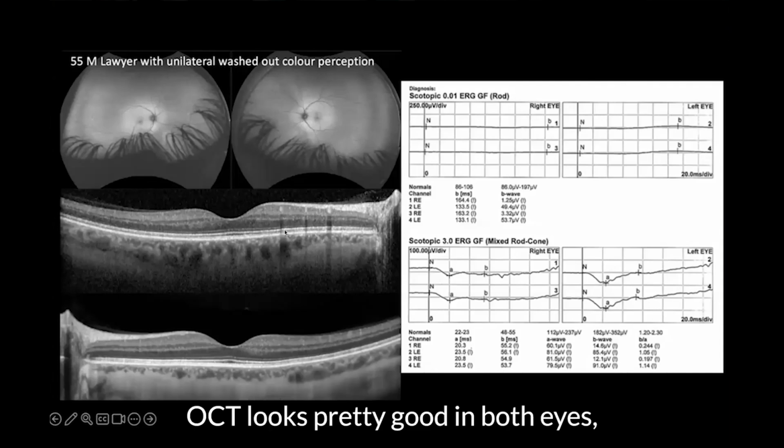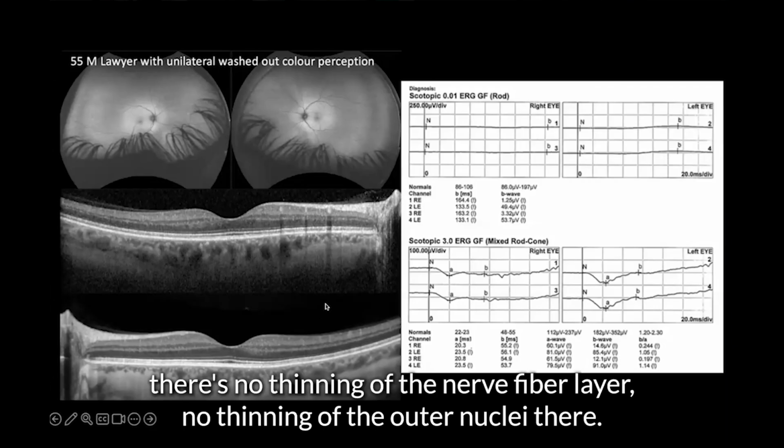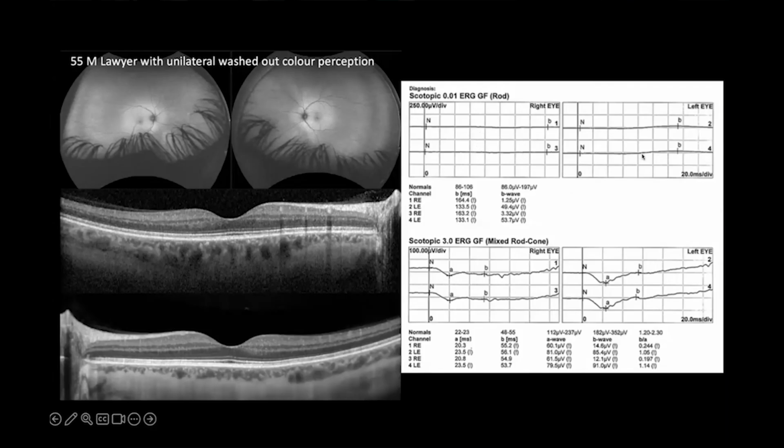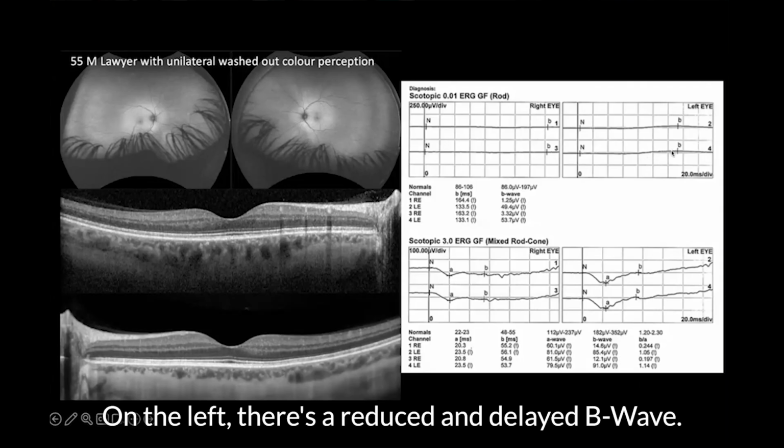And OCT looks pretty good in both eyes. There's no thinning of the nerve fiber layer, no thinning of the outer nuclear layer. But on dark adapted testing, you can see that it's almost flat in the right. On the left, there's a reduced and delayed B wave.